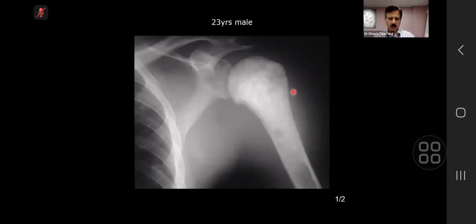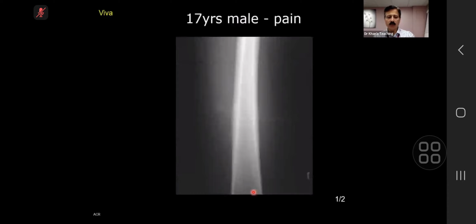There's an appreciable soft tissue component to the lateral aspect, and in the same region there's periosteal reaction. And again, a wide zone of transition. Right. And always look for any soft tissue. Within the soft tissue, if there is an osseous component, call that, because that's a key finding for bone-forming tumor.